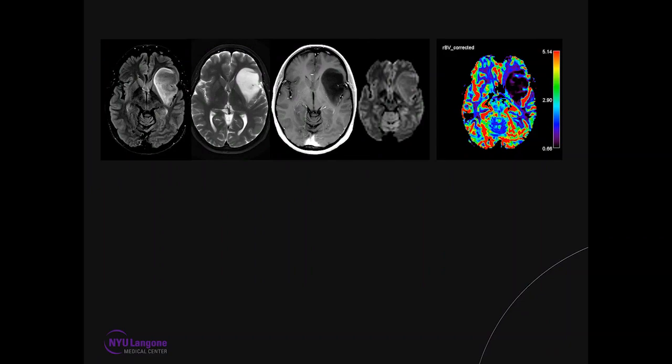Once this genomic subclassification system became a little bit more clear in the last 7-8 years, we have been looking at some of these morphologic imaging features. For example, we discovered a feature, we started calling it the T2-FLAIR mismatch sign, which was published in Clinical Cancer Research in 2017. The important aspect of this feature is that these are tumors occurring in younger patients, clinically intact.